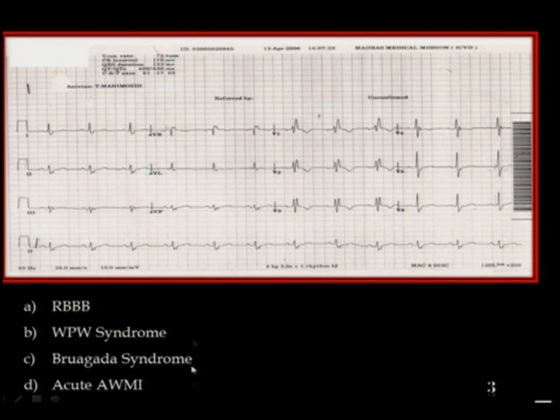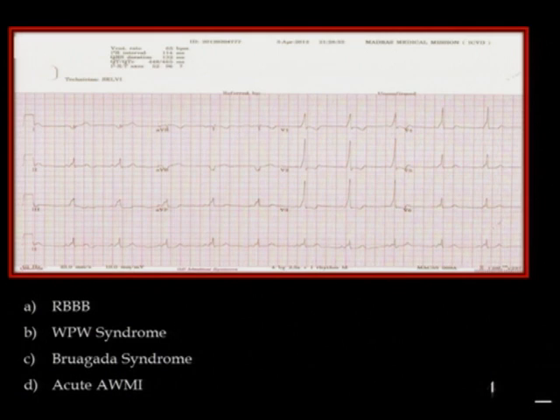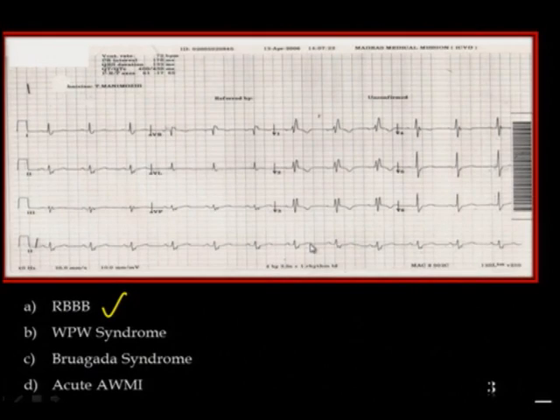Acute anterior wall MI is sometimes also entertained with this ECG. The T wave inversions are physiological and secondary to the right bundle branch block. A little bit of elevation of the ST segment is an integral component of a typical right bundle branch block. There's another right bundle branch block pattern here. You have a short PR and a delta wave, so there's no confusion. Many a time, people have confused these two ECGs with Brugada and an anterior wall MI. That is why this has been shown.